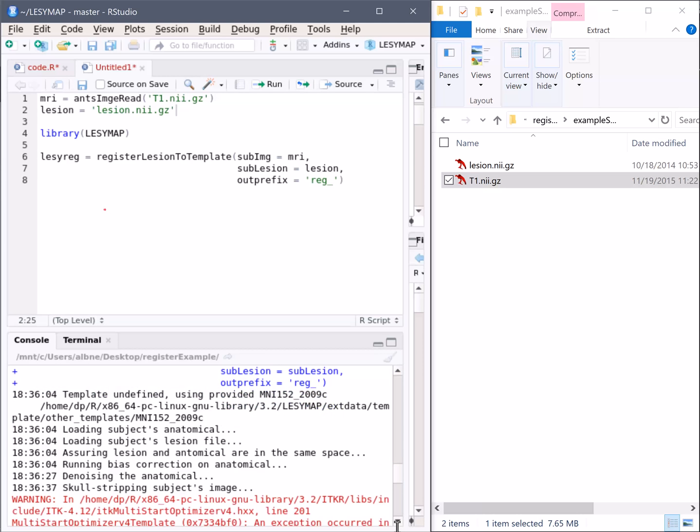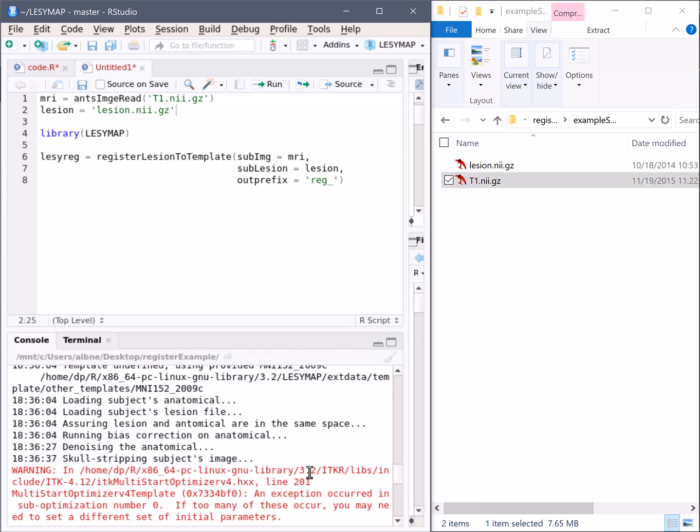Skull stripping helps a lot because once the skull is removed and only the brain is left, you can do a brain-to-brain registration. This will help a lot to get the gyri in the same place, without the registration being affected by the skull itself. If you leave the skull, the registration is still going to be decent and good, but the skull will take a toll, let's say, on the outcome of the registration.